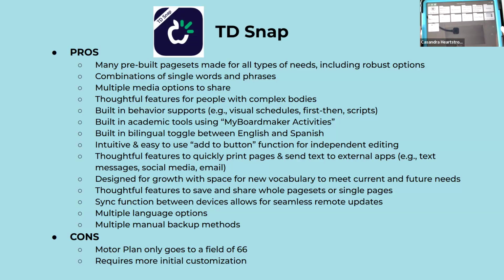This is especially great for the kids who don't want to release the device from their hands. You can do math and morning meeting. These are just the options that I have loaded on here, but there's tons of different books and learning tools that can be added in. There's a great built-in bilingual toggle if you've got a bilingual user.